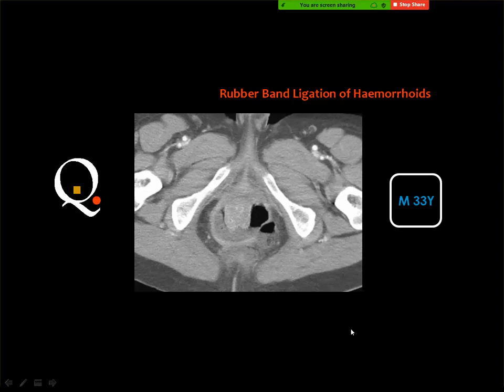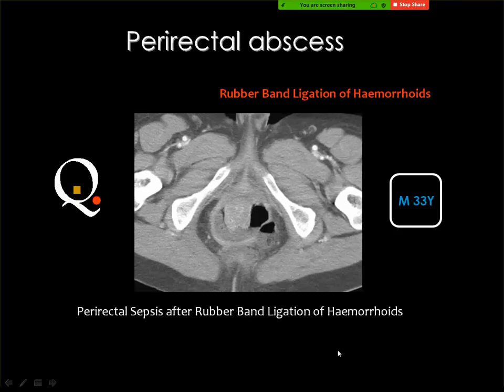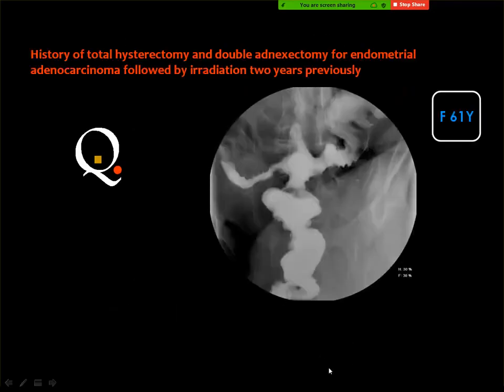Hernia. Rectal mass. Yes. This is the anal canal, and this is the ischioanal fossa. Then you see a collection that is marginally enhancing and contain air fluid level, diagnostic of abscess. Yes, and this is a perirectal abscess.